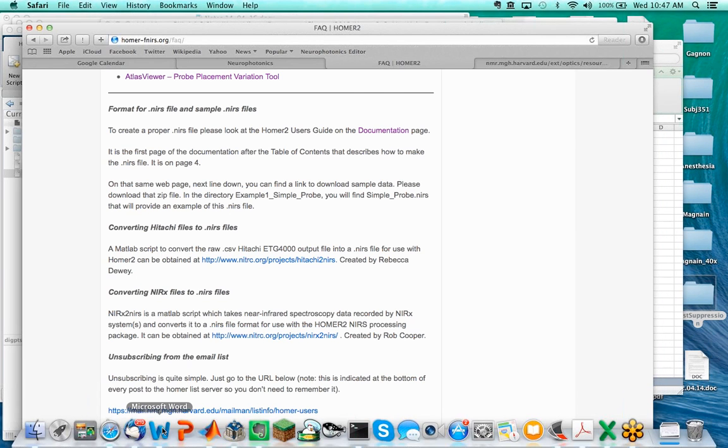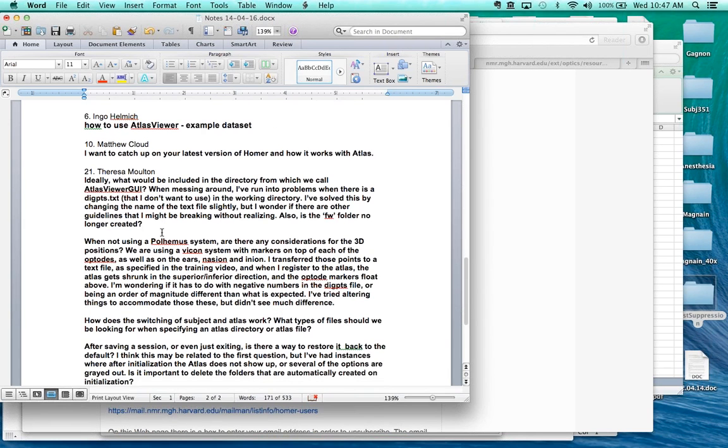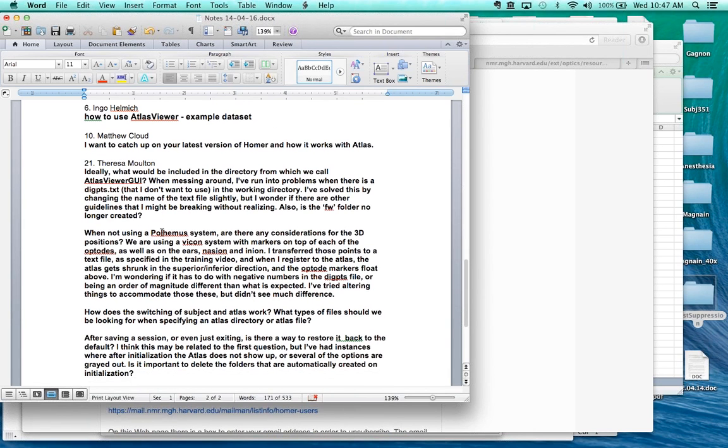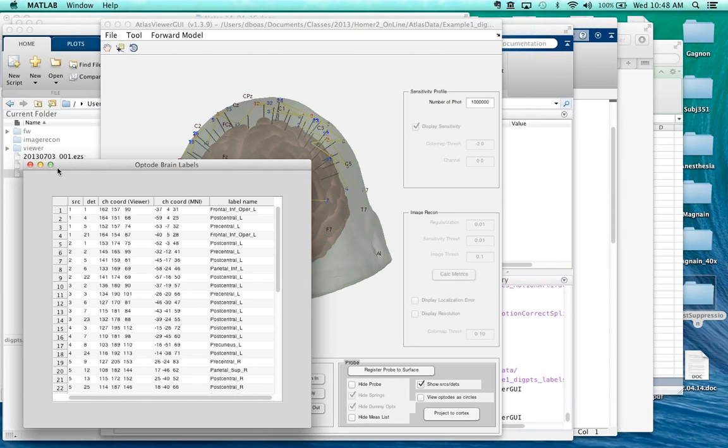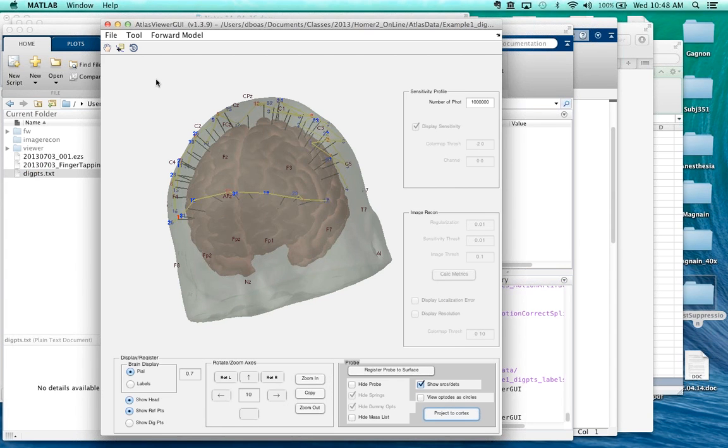So looking back at Trace's questions. So Trace, help me out with your questions. Yeah, I think that definitely covered the question about the DigPoint file, about the units that it's meant to be in. Oh, when I was downloading the CSV, I noticed that there's a couple of different atlases. It looked like there was like newborn ones and things like this, and I just tried to briefly mess around with how to change those, and I was curious if you could maybe touch on how you might see something different. Yep.